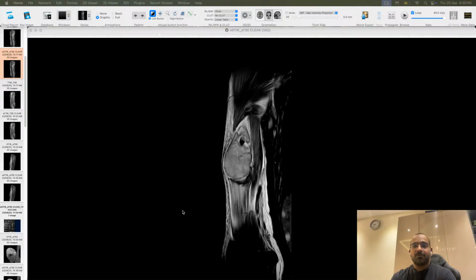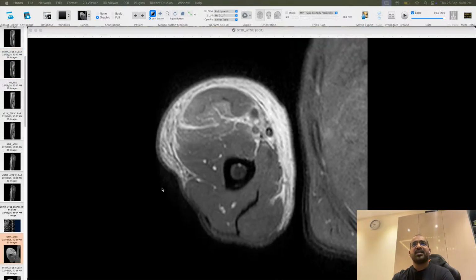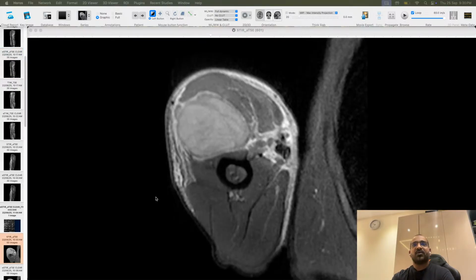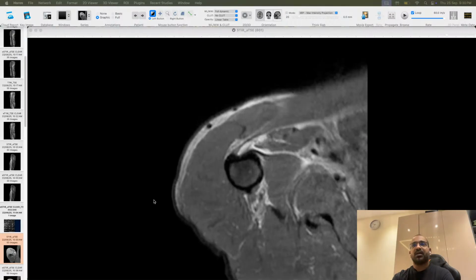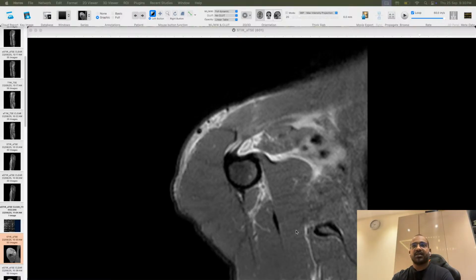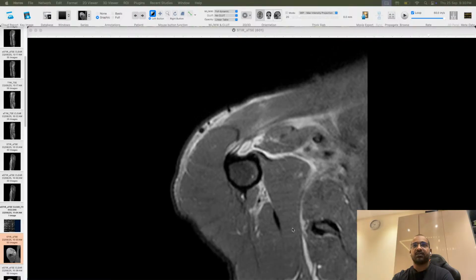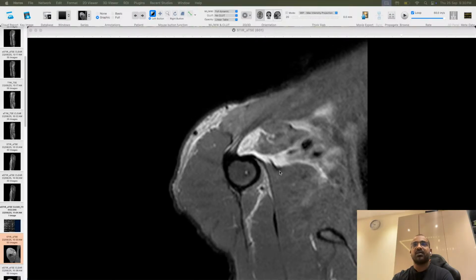So what could be the pathology? Are we seeing something over here? Hematoma is there. Is it a muscle hematoma, an intramuscular hematoma? Or is it only hematoma here in this case? I'll start scrolling from the superior most part, whichever is available. In the previous case, I was mentioning the teres major, right? See here, this is the one. Teres major muscle insertion. This is pectoralis.